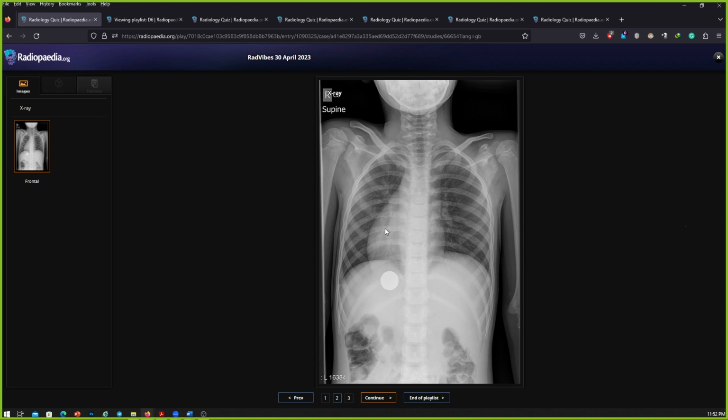Okay, very good, dextrocardia, and then you realized very late, but you did, that this is a case of total situs inversus with a foreign body in the stomach. In the FRCR exam, it is very unlikely that you would be given a radiograph or any imaging with an artifact. If they do, they will talk about the artifact, which is still less likely because artifacts have already been covered in FRCR physics. So do not assume that it's an artifact unless they tell you.